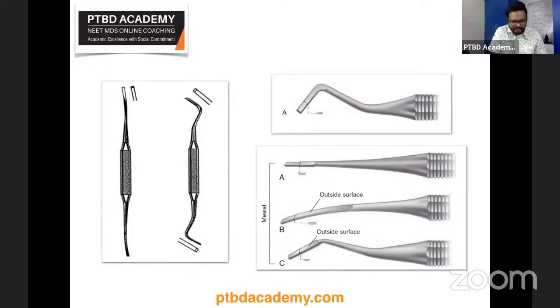The enamel hatchet is a chisel similar in design to the ordinary hatchet, except that the blade is larger, heavier, and beveled only on one side. So this you're very clear on. It has its cutting edges in a plane that is parallel with the axis of the handle. Consider this very important. It's used for cutting enamel and comes as right or left types for use on opposite sides of the preparation. So in this screen, the top right illustration represents the enamel hatchet. Then we'll move on to the left illustration. These are chisels. So what chisels are they?